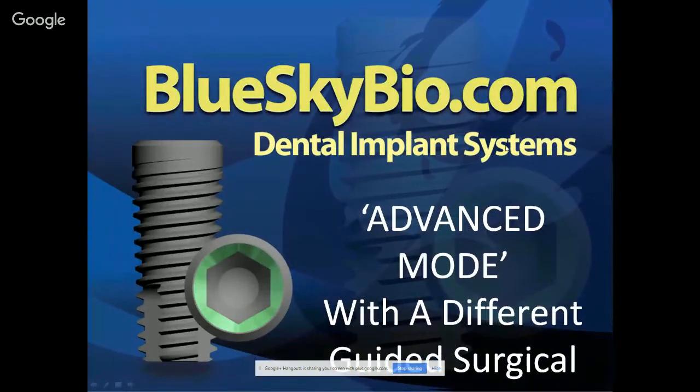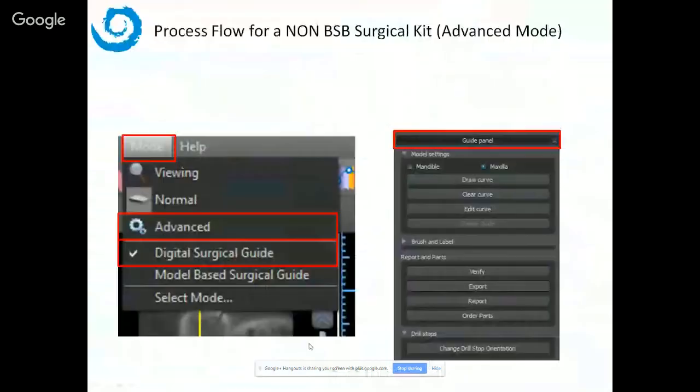Okay, that was the process flow for the normal mode. Quite simple, using the Blue Sky Bio drills, hopefully the handpiece, hopefully the implants, and it takes you through a process that's quite quick and easy. Now we're talking about the use of the advanced mode, primarily if you're using a different guided surgical kit. Again, it's not advanced trigonometry or whatever it is, but there's a couple of numbers that have to be manually put into the software.